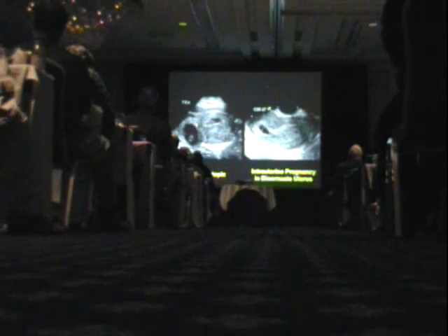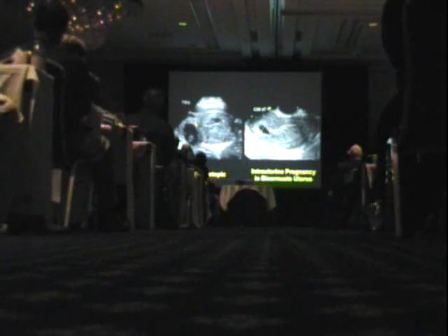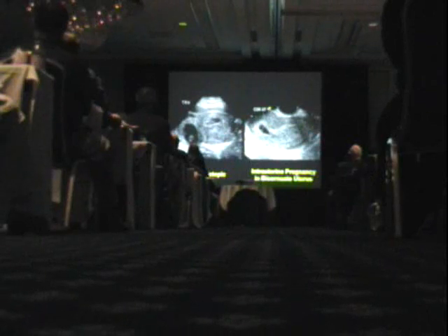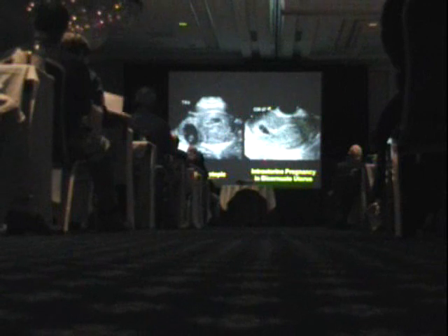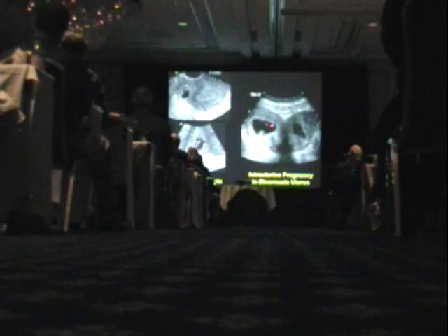So, a couple of side-by-side examples. A little fluid in the endometrial cavity. More importantly, the gestational sac is out here in the right adnexa, in the right cornua. There is bright trophoblastic tissue, but no hypoechoic myometrium around the edge, unlike this eccentric sac that has plenty of myometrium around it. This is an intrauterine pregnancy. It happens to be in a bicornuate uterus. Emergency, no emergency. This pregnancy has a good chance of making it.